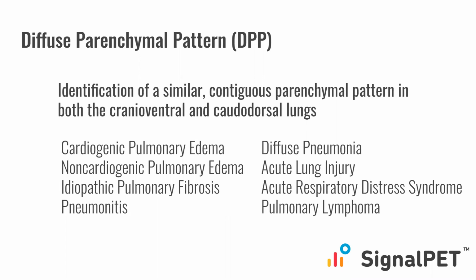It ranges from artifactual, say an obese animal where there's just increased opacity in the lungs, to something like acute respiratory distress syndrome or DIC. The other thing is there's no good way to diagnose a lot of those differentials. Definitely frustrating, but anyhow, these are some of the differentials that we do see more often in this particular pattern.